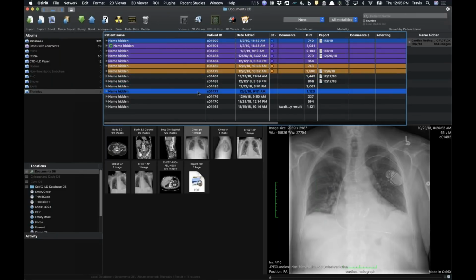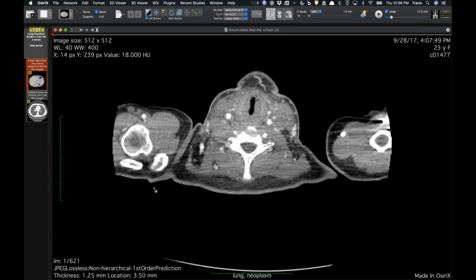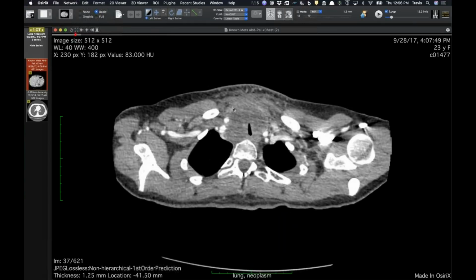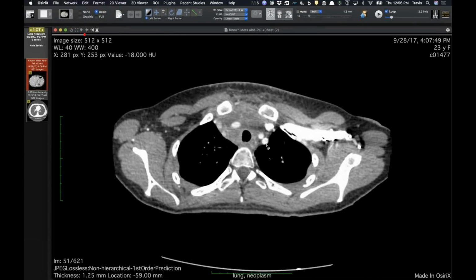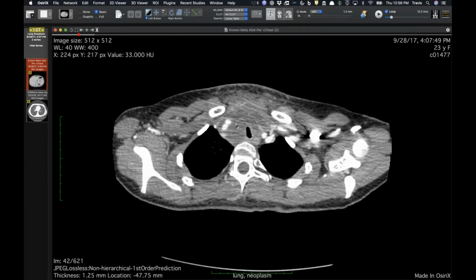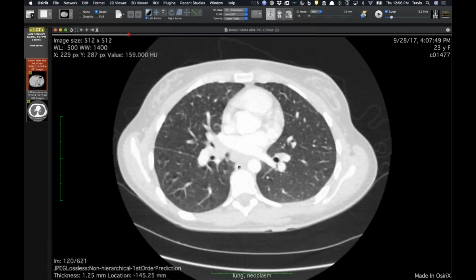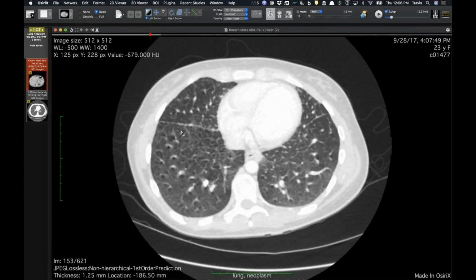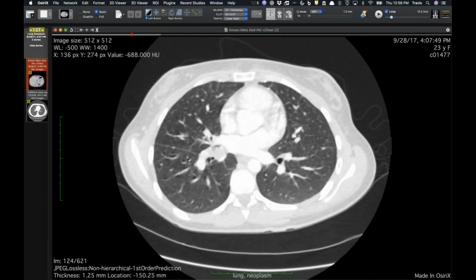Yep. All right. Well, this one I know I didn't show, but I will show it quickly, and then we'll finish. This is a patient who you can see has a really ugly looking thyroid that's considerably narrowing the trachea. And so this certainly looks like, and is, thyroid cancer. And they have lymphadenopathy as well. And you can see on this one, as David was saying, looking at the lung windows can often be helpful for looking for pleural metastatic disease.